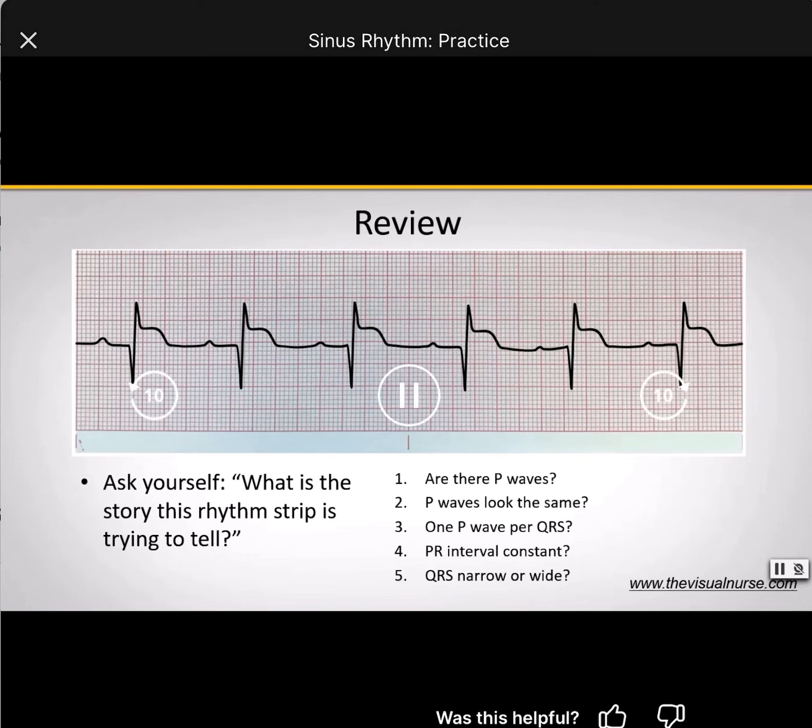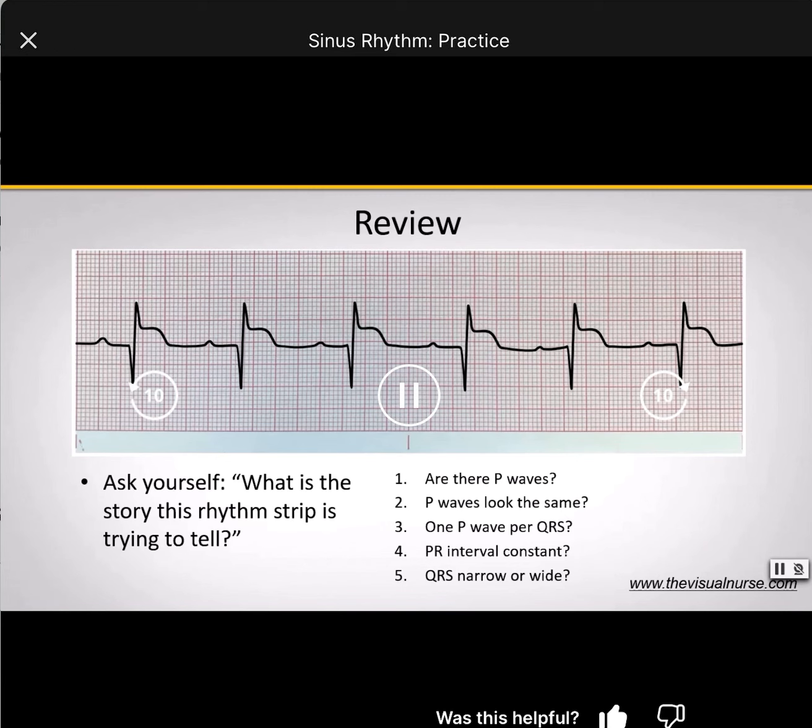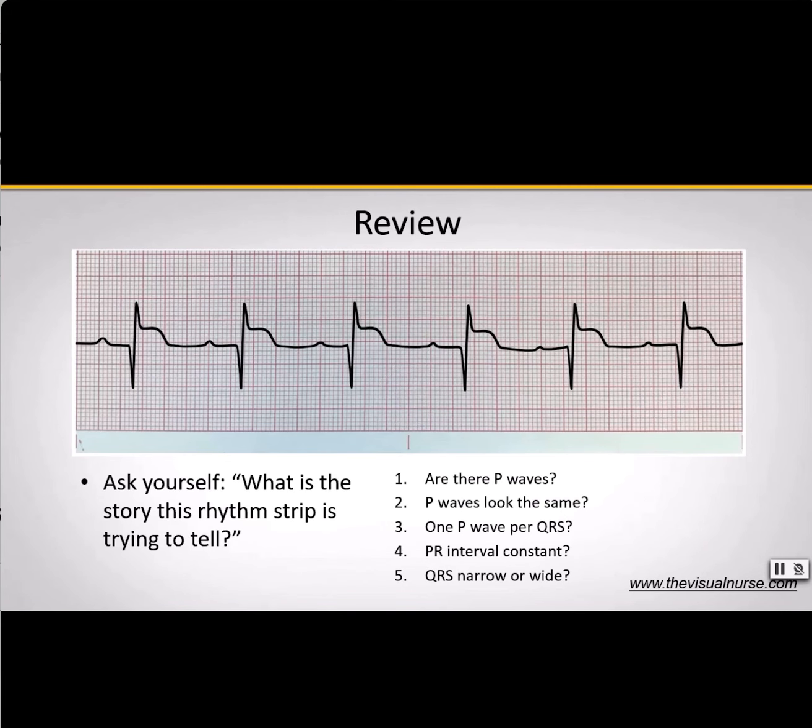Remember, this is the reason why we spent so much time on the cardiac cycle, because we really wanted to drive home the point that each one of these waveforms and intervals is telling a story. It's our job to figure out what that story is, okay? So some questions that we can ask ourselves when we first look at our rhythm strip.